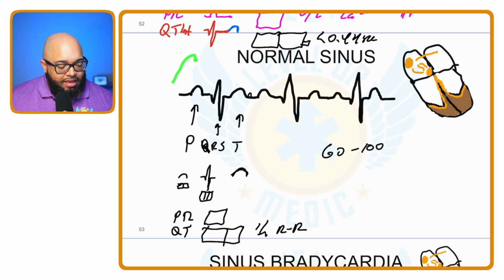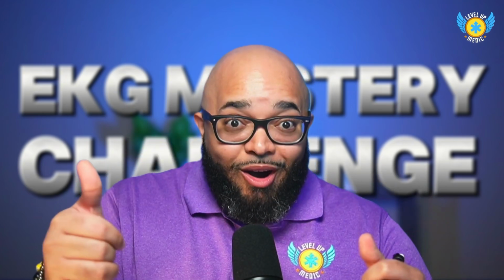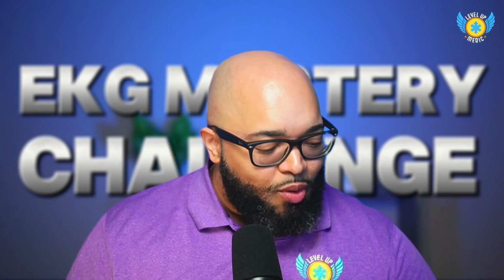Let's say in this situation, this first part is bigger. We would say there's right atrial enlargement. On the other hand, let's say the second part is bigger. We'd say we have left atrial enlargement, right? So just by knowing normal very well, I can more easily figure out abnormal, okay?